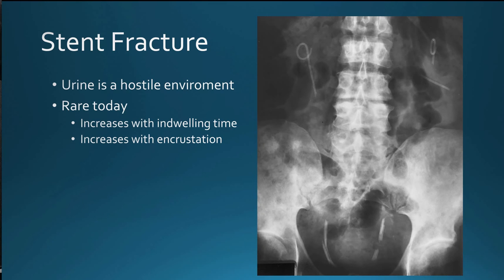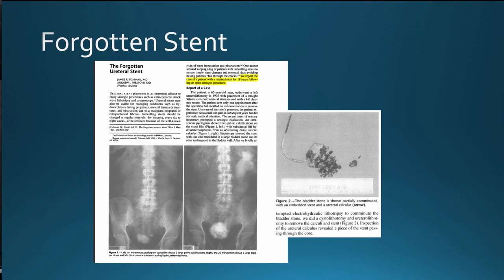Stents can break, especially when encrusted. Less common nowadays. And then finally, stents can be forgotten. The patient had a stone obstructing, the stent was placed, the stone passed or whatever, and they never went back to the doctor, but show up 20 years later for the evaluation of either urinary tract symptoms or something else.